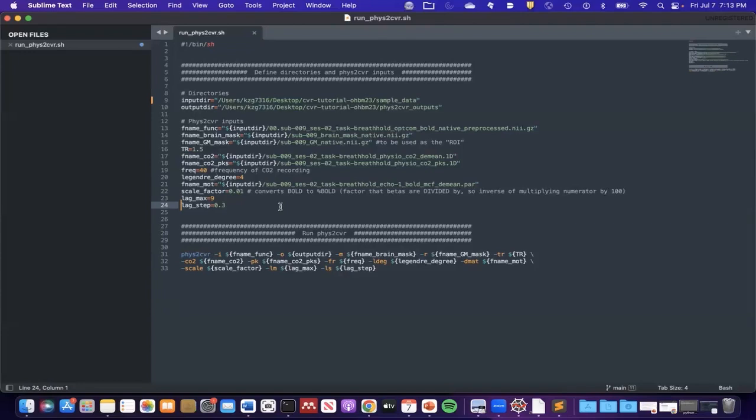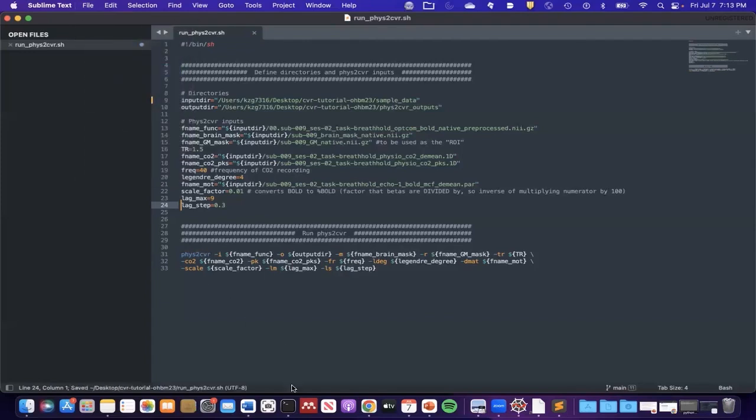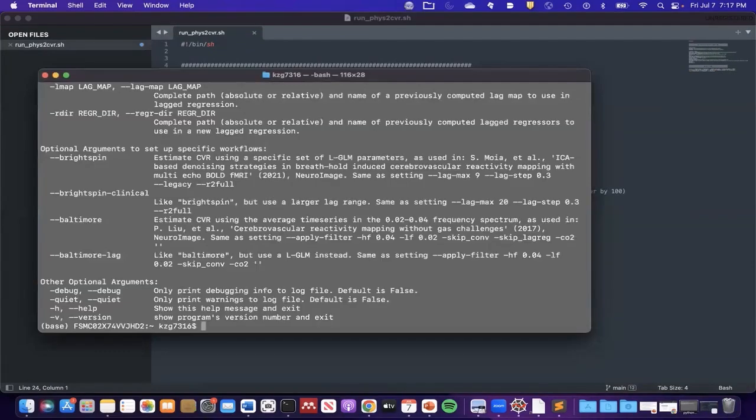And you can see here, we have several file outputs. In the tutorial video, I have listed a summary of the outputs, what each file name contains for your reference, and we're only going to go through a few key ones in the interest of time.